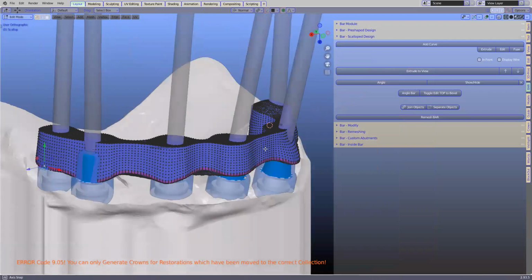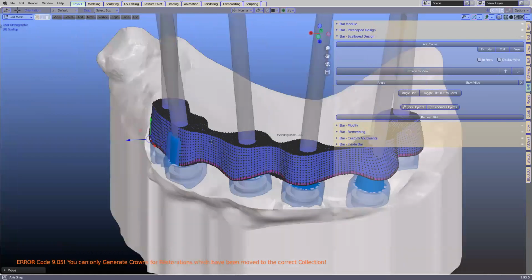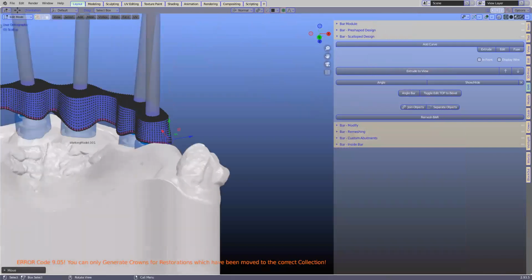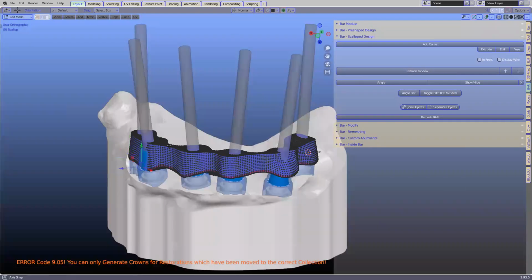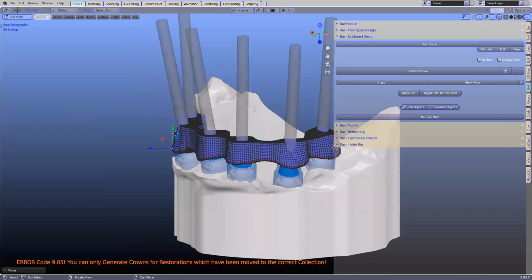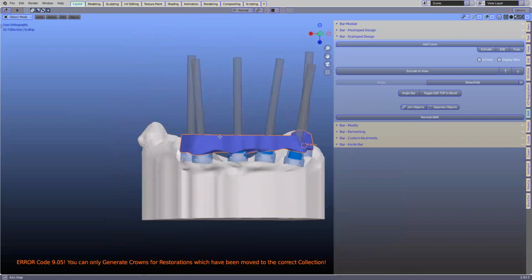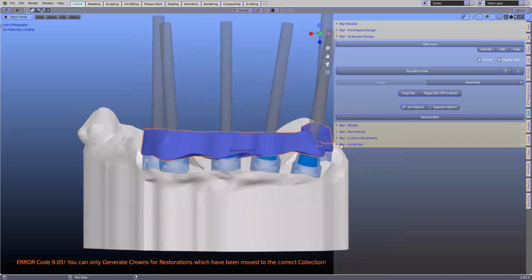So like this. All of the blue bottles, I call them bottles, are sort of hidden within the inside. That's for good reason, because we are able to extract the surface with the click of a button. So you can imagine we would then join them.